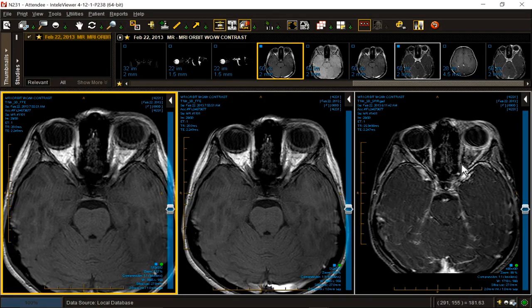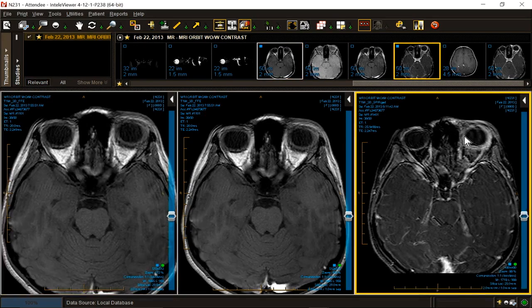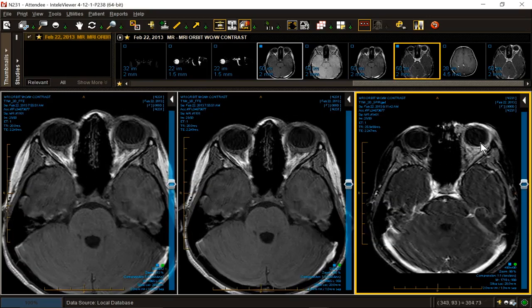And you might have thought about endophthalmitis secondary to CMV or toxo, but the patient would have a greater degree of symptomatology, so the history just simply didn't fit. And those are causes of leukocoria. This patient did not have leukocoria, by the way, and has none of the signs of Coates disease, a lipoproteinaceous effusion, persistent hyaloid artery. None of those are present. So it's an inflammatory process. It's a benign one based on the history. That's how you come up with the diagnosis. Without history, you're really stuck.